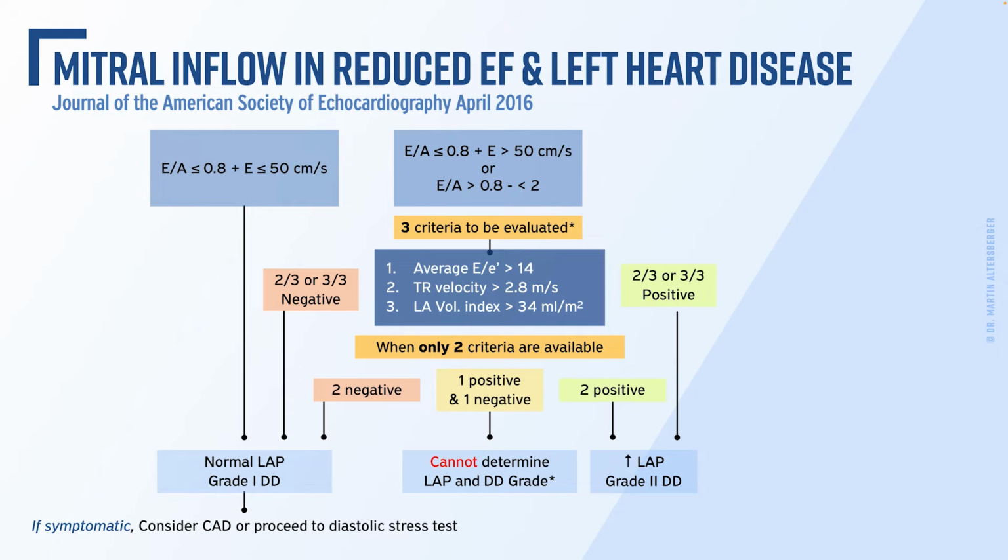We have several measurements at hand which can be used in this case. For example, I'm a huge fan of left atrial strain, but also you can use the pulmonary venous signal, and in my point of view, also the pulmonary acceleration time we also discussed in a prior video.